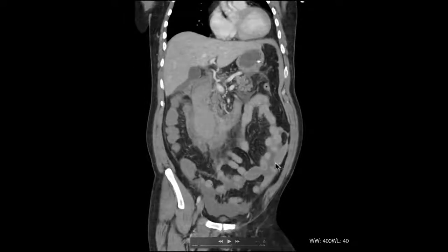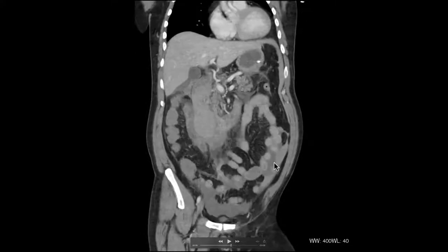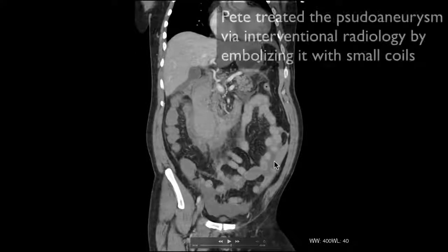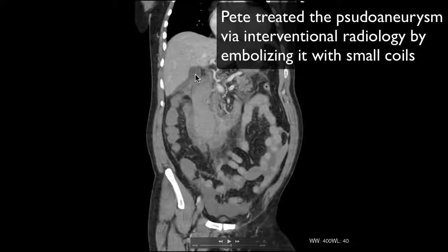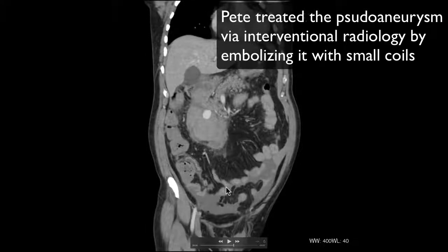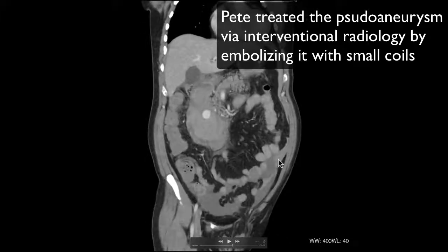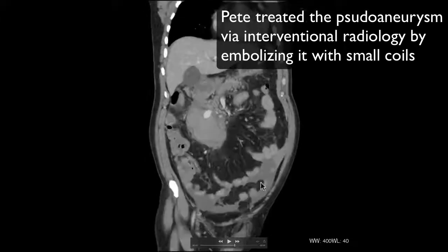And that's the same shade of grey as the other blood you saw before, or pretty close to it. Well, this bit here is haematoma. That bit there is similar to the blood in and around the duodenum. This darker stuff is just free fluid. You can see the difference there, and that dark stuff is much more similar to liquid blood. Completely fresh blood that hasn't clotted will be slightly darker than clotted blood, which you can see the stuff in the left side of the abdomen is.